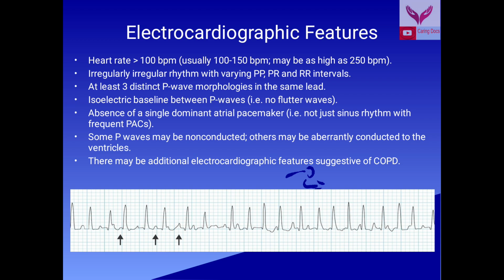There is absence of a single dominant atrial pacemaker, that is, it is not just a sinus rhythm with frequent PACs. Some P waves may be non-conducted and others may be aberrantly conducted to the ventricles. There may be additional electrocardiographic features suggestive of COPD.